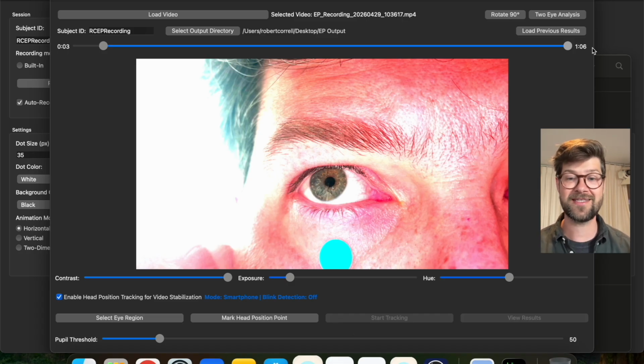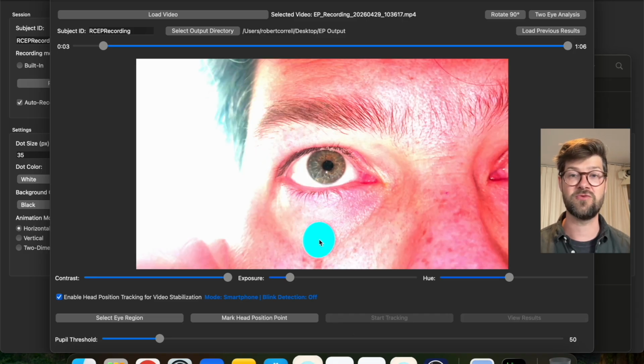Ideally, you want to avoid this, having the blue dot visible all of the time. I keep saying blue dot, you can use a different colour, as long as it's a colour which clearly shows up on the video. Having the dot visible all of the time is definitely better. We'll see in the results that this is a little less than ideal what happens here, but it still works. So we checked for the blue dot in the frame there. We're going to mark it in a second.